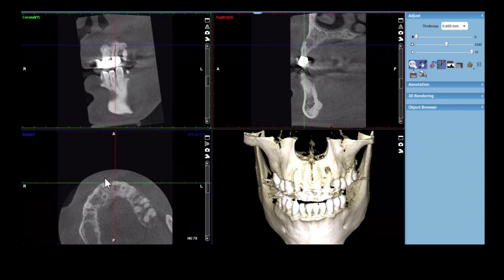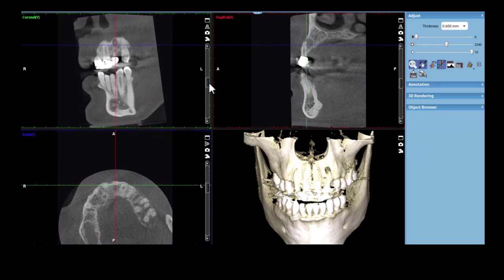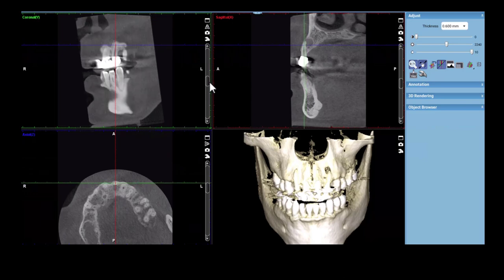And so in this case, once we're in the sagittal plane, we are in the coronal plane here, and then on the lower left here, you can see it looks like a bullseye straight down the canal of the tooth. Now, from here we can get a nice view of the lesion on the upper right there, and if we want, we can slide in and out on the coronal view to see it in that view. But I am certainly satisfied to just have this view for now, with these lines, everything in the canal.